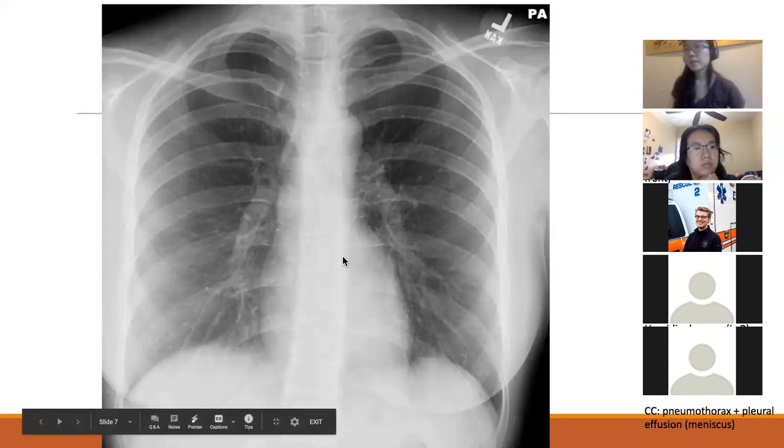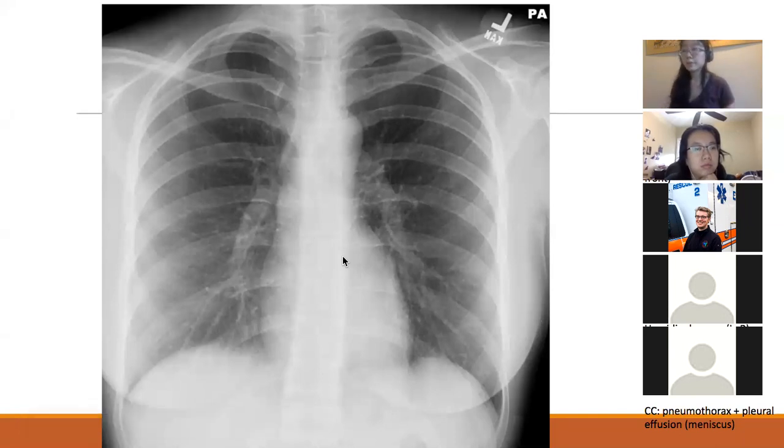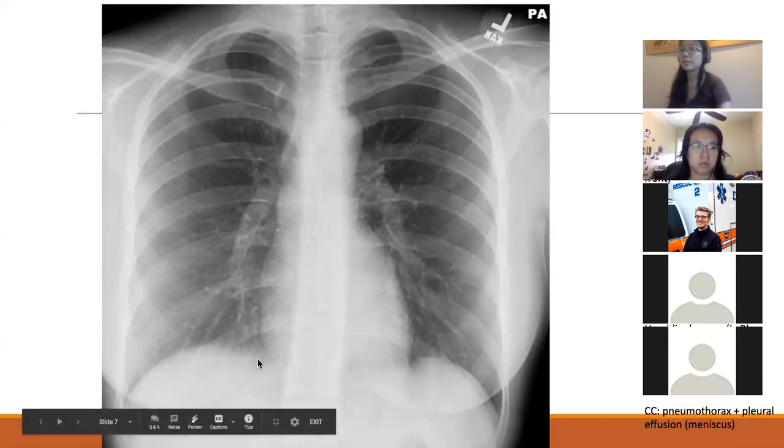Okay. So one of your other clinical correlations is cardiac tamponade. You guys aren't responsible for knowing what that looks like on imaging, but for those curious, and for the MS2s in chat, we would have a water bottle sign. The heart would sort of widen a little bit, and it'd be harder to see the gap between the diaphragm and the heart. So I sort of gave away the next structure, which is the diaphragm right here. These two bumps show the structure of the diaphragm.